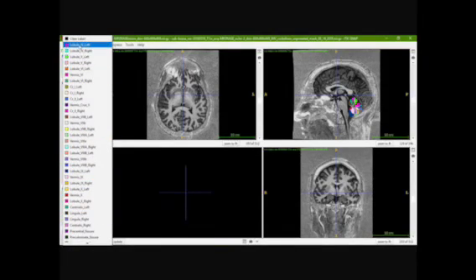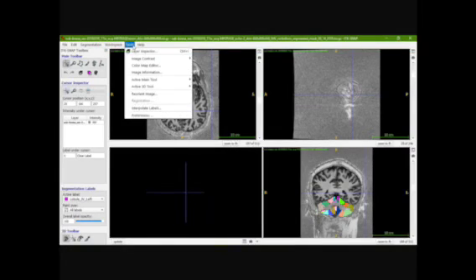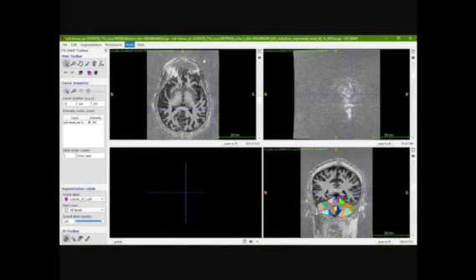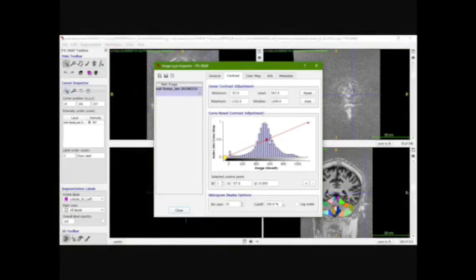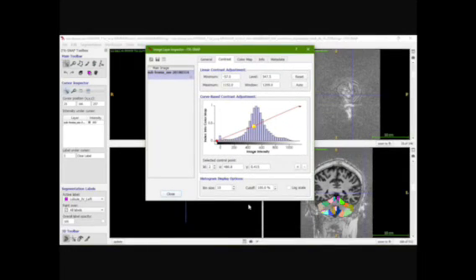Each of them belongs to an anatomical lobule or region of the cerebellum, which is where I was working. The first thing that I want to show you is the image contrast. That is something that you can change in Tools, Image Contrast Adjustment, and you can just move this graph that is here. Whenever you move it, you can change the contrast, and that might be helpful whenever you are trying to identify a certain region of the brain or an anatomical lobule.